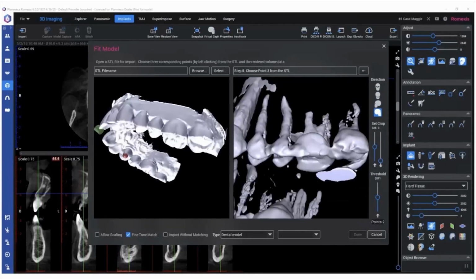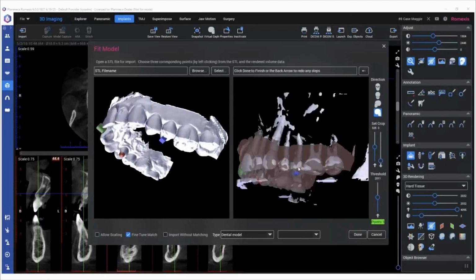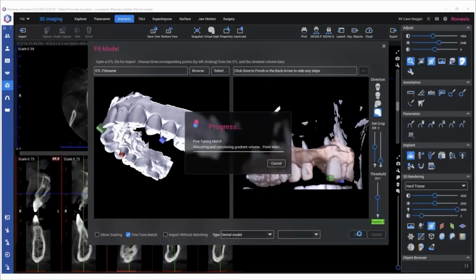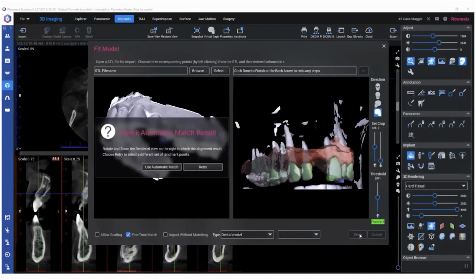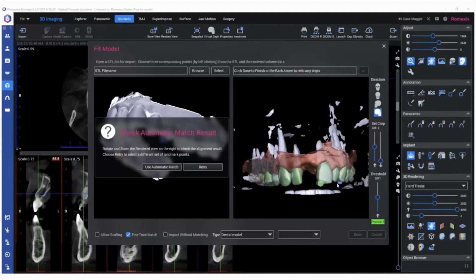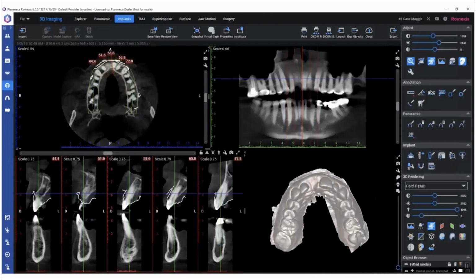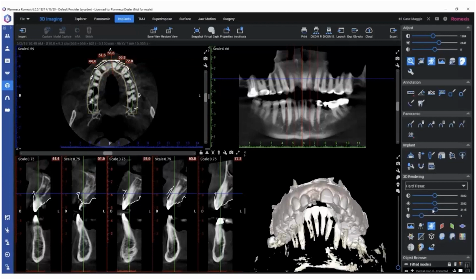Now, what are those points? They're going to be teeth or restorative surfaces, right? So you're trying to find, spread out, common data points to allow the computer to fit these things together. Once we have that, the computer is going to run an algorithm to do a best fit analysis and fine-tune the fit of the intraoral scan to the CT scan. And by the way, green is good. If you see green all the way across, I'm confident to use that merge moving forward.